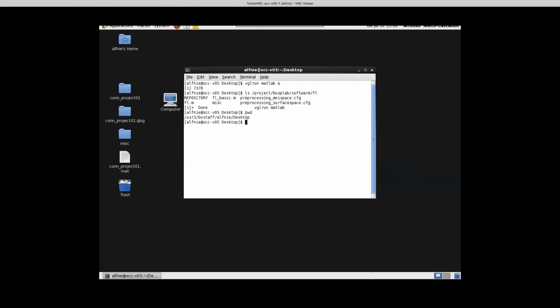So FS average, FreeSurfer has a representation of these pretty pictures of the sulci and gyri, like images on a sphere. It basically has a template that is actually on the sphere and represents how the gyri and sulci of individual subjects should match on a sphere. What it does is it looks at the inflated brain of every subject on the sphere, and it tries to match whatever it finds in terms of where the gyri and the sulci are on the sphere to where they actually should be if the subject was in FS average space. And that's where the nonlinear transformation happens in surface level analysis.